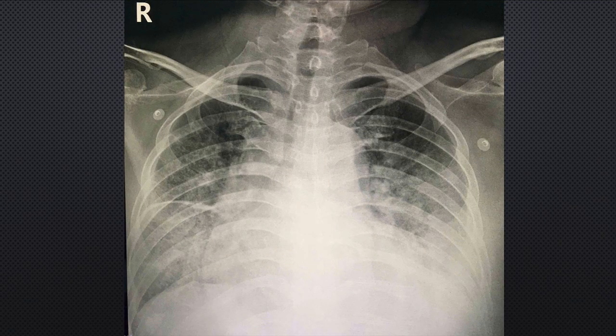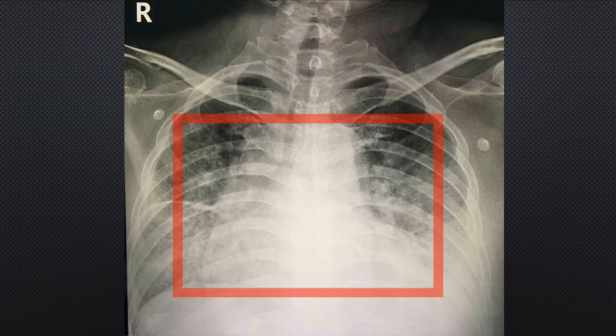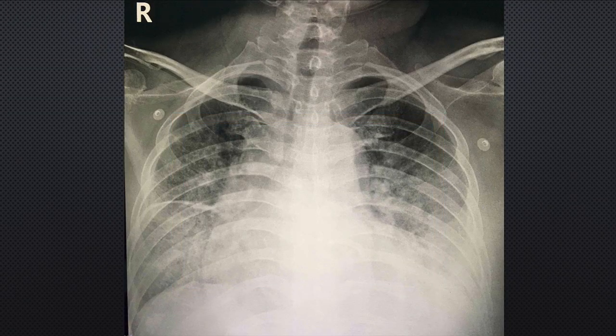This is a nice example of a common chest pathology, heart failure with pulmonary edema and bilateral pleural effusions. You'll notice that unlike on the prior chest X-rays, in this case the heart shadow appears enlarged and along its left side is difficult to discern. The pulmonary vascular markings are obscured and there is increased density throughout the mid and lower lung zones in a symmetrical fashion bilaterally. There's increased density throughout both lungs that appears fairly similar from right to left.